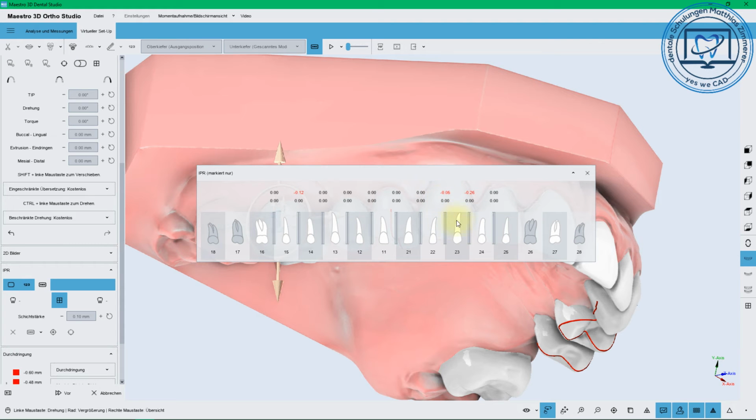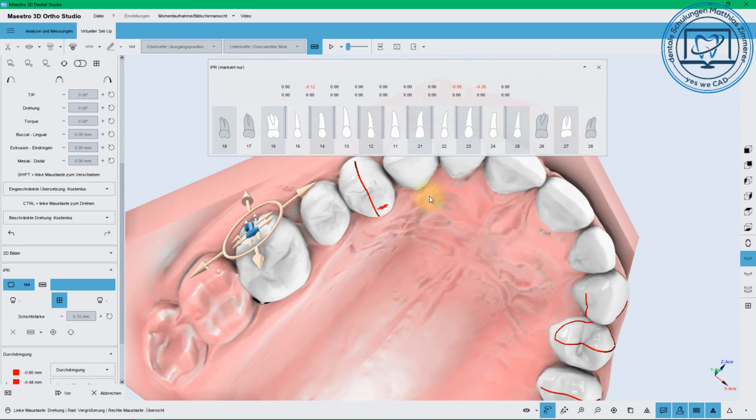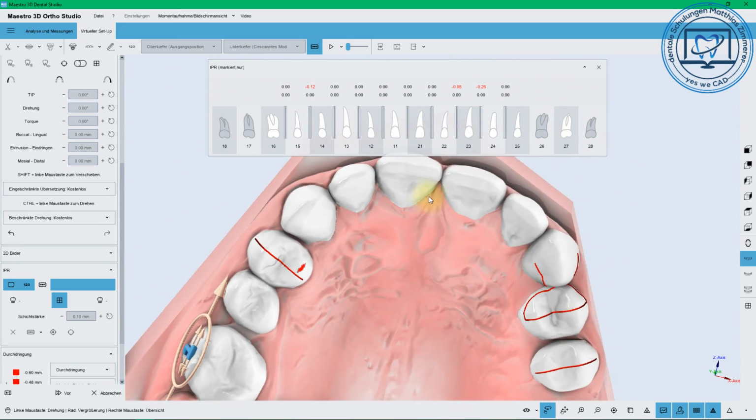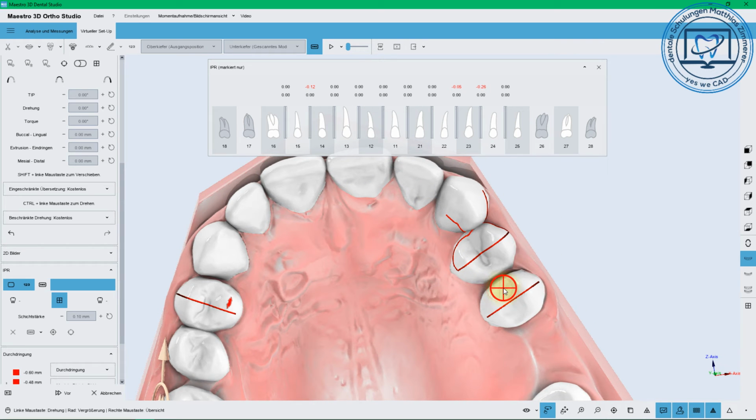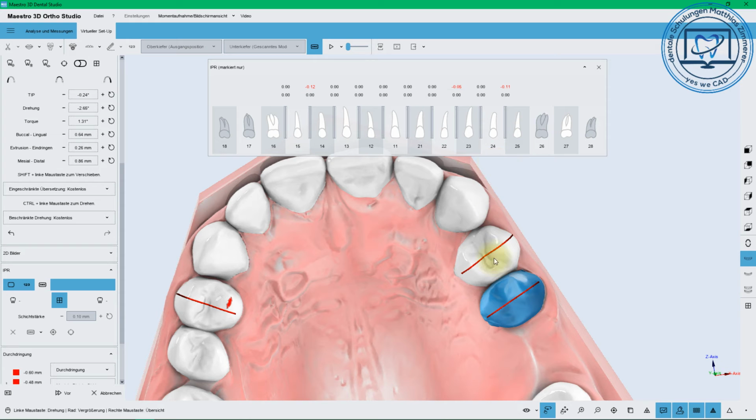Definitely, you can turn it up. You can also minimize that. Everywhere. The software calculates sometimes if it's turned on, and will tell you it isn't needed, or just 0.05. But beware, it's always calculating and takes a little bit of time. Yes, between these two.